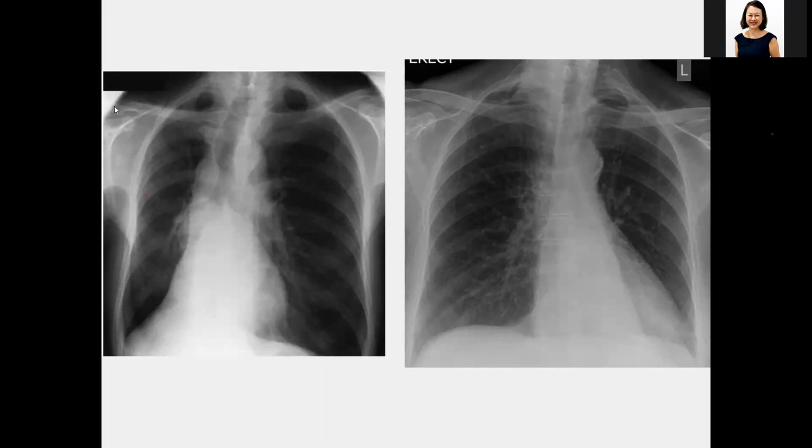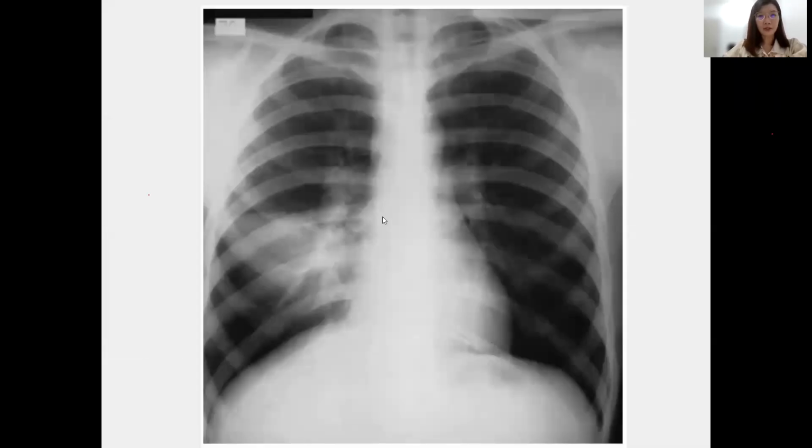Okay. Jia Jing Li said left lower lobe collapse. Yes, I think so. So most say left lower lobe collapse. Yes, good. So this is left lower lobe collapse. Again, the triangular shape at the retrocardiac region. So I guess after the presentation, everyone can identify the collapse very well. And always remember, look at the retrocardiac region when we review the X-ray. Okay. What about this?